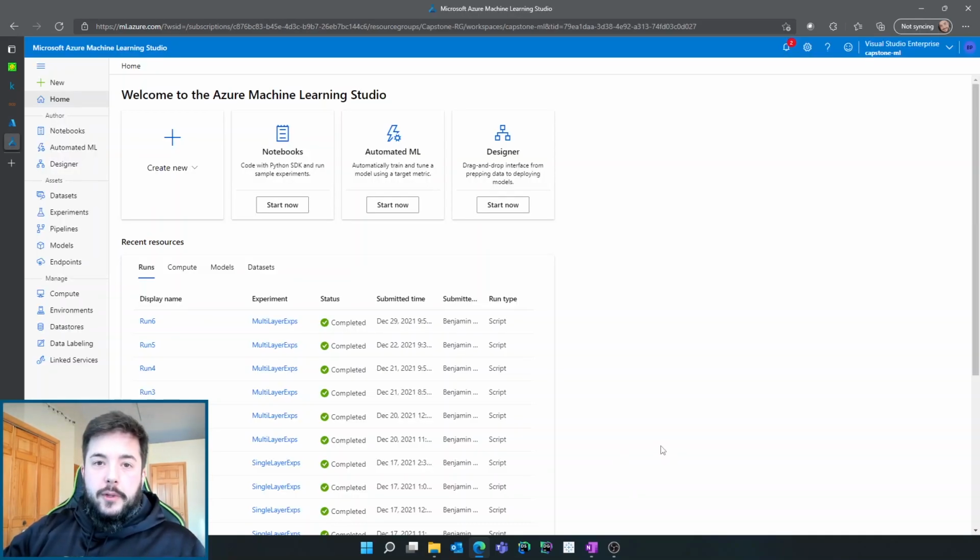All right, so let's get started with Azure ML. With Azure ML, the first thing I want to show is that you have a navigation pane here on the left side. They break this out into 3 core sections: author, assets, and manage. Manage is your underlying infrastructure that will support Azure ML and your different projects on Azure ML. So you can think of this as connecting your compute instances, provisioning compute instances, creating inference instances, and connecting data stores or databases or something else that you're going to pull data into the workspace with.